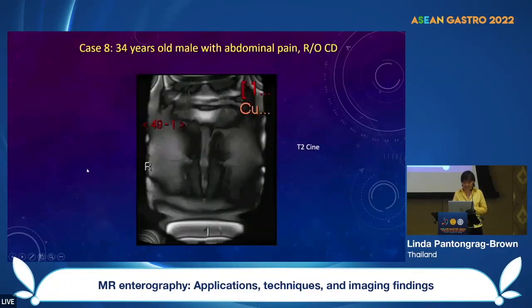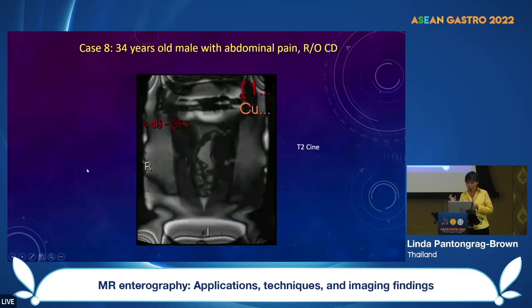This is my last case. This is a 34-year-old gentleman, again from the Middle Eastern region, presenting with abdominal pain, rule out Crohn's disease, sent to us by a gastroenterologist. This is a cine movie view.